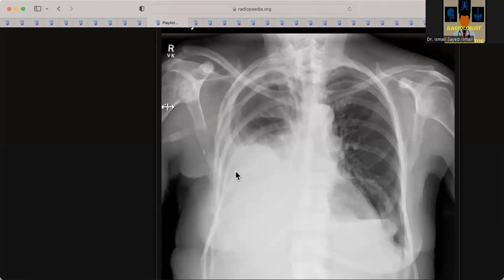There are two other clues here that give away the diagnosis of the primary. There is a crowding of the ribs. Yes, I think there is a crowding of the ribs. I think that there is also a destructive rib lesion seen in the lower ribs. So it could be due to a mass lesion within the right lower lung lobe. However, for better evaluation and confirmation, I will advise a chest, abdomen, and pelvis CT scan with IV contrast for better characterization.